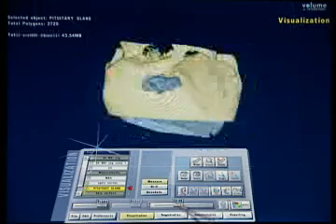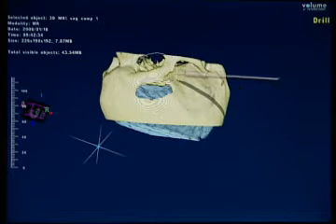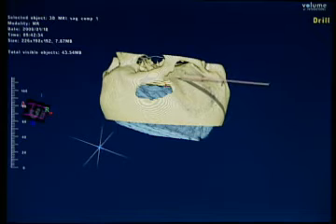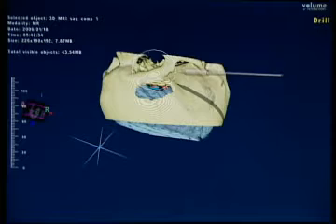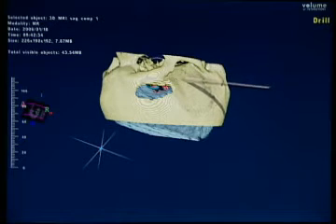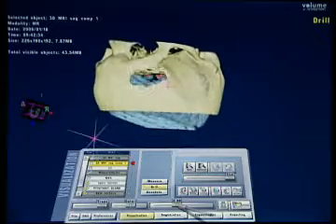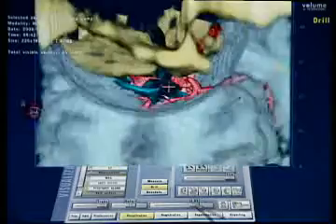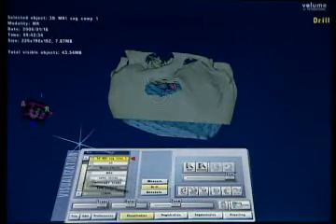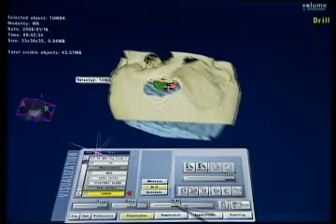So what I can do is I can do something like simulating gently the way the retractors would come in. Okay? Gently, okay? Sometimes, when we're working under higher magnification, you would like to have that information of surrounding tissue in there. Otherwise, it feels a bit too empty when you're in there.